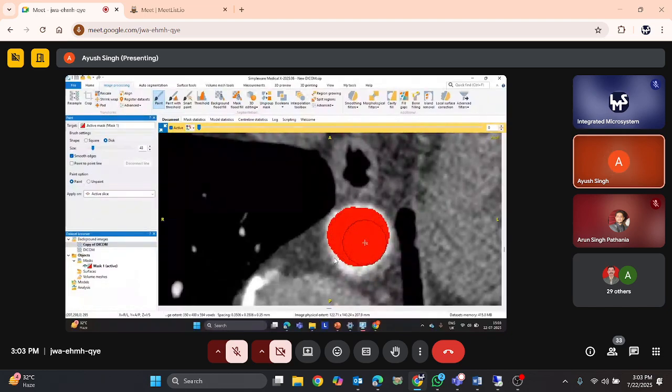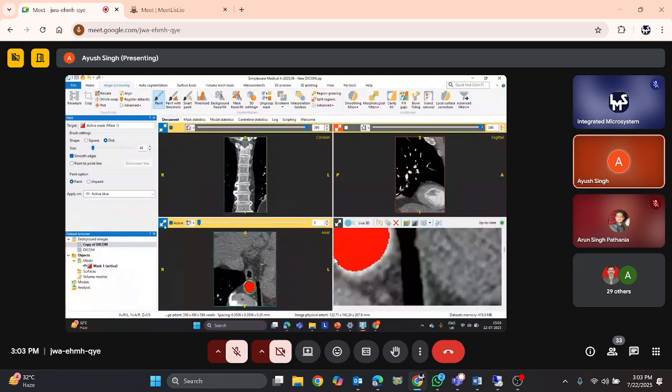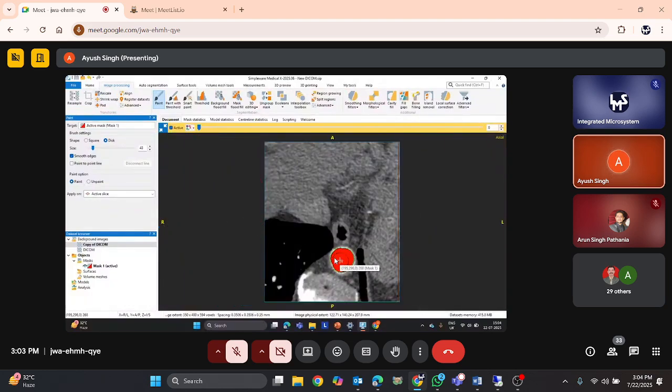Now, the most difficult part in this type of operation is that we have worked on one slice, we have taken a new axial view, we have worked on the zeroth slice. So when it does the mapping, it will consider only the zeroth slice of the axial view while generating a mask. Similar to that, once we have done zero, we can control the slices through the scroller on our mouse.